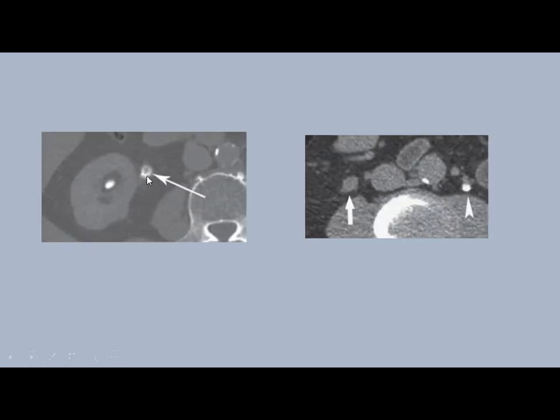Again, tumor in the ureter, or transitional cell. There is the filling defect, outlined by the contrast excreted in urography. And if you compare these two images, there is excretion of the contrast in the left ureter with opacification, but the right ureter is not opacified due to an obstruction by a soft tissue mass, which is pointed.